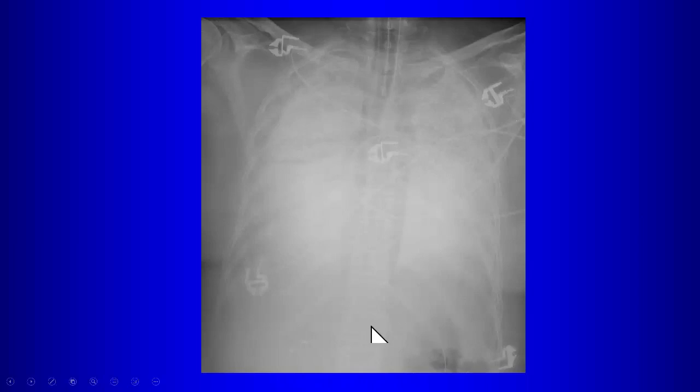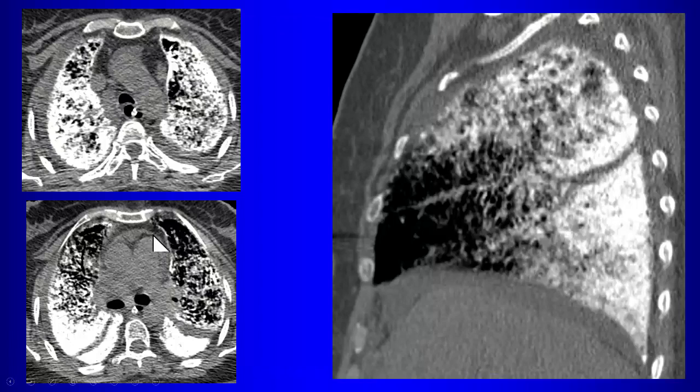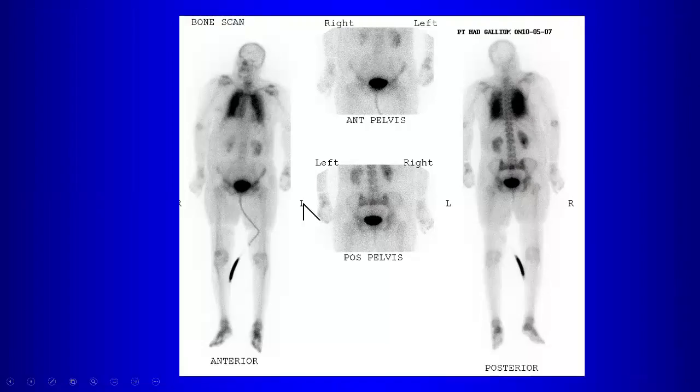What about the abdomen? It's also less dense than the lungs, right? So is this consolidation in the lungs, or is this something else? Consolidation gives you the same attenuation as the soft tissues, right? It doesn't make the lungs denser than everything else. So if the lungs are denser than everything else, now you're thinking about what? Calcification, right? So what entity can give you diffuse calcification like that within the lungs? Alveolar microlithiasis, right? Pulmonary alveolar microlithiasis, and it also has a pathognomonic finding on this study.